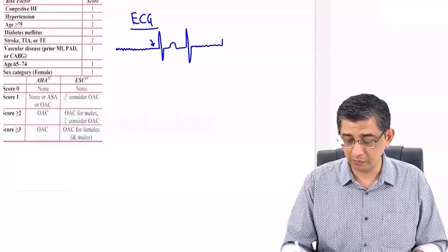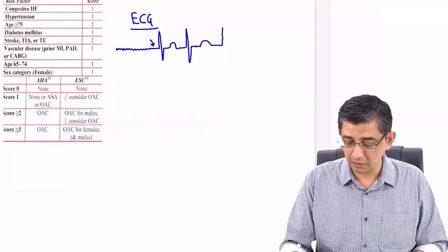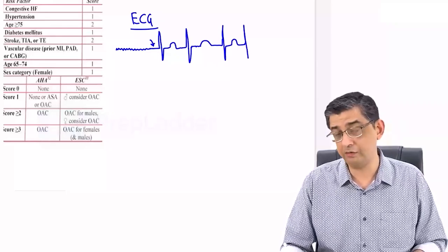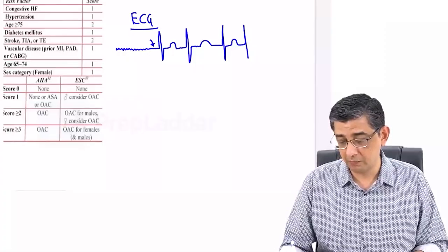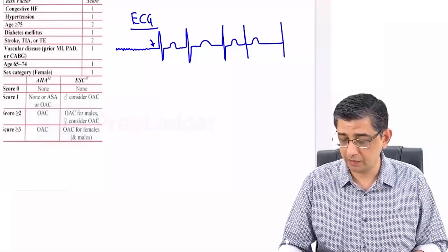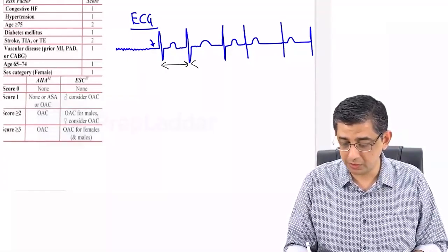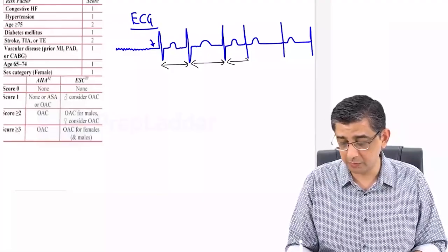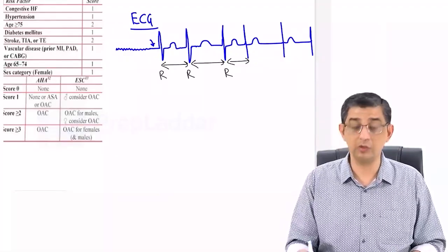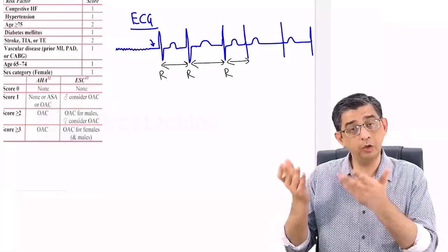And then the next problem that will come up is, again, I'll just highlight the fast beating of the heart, and a very characteristic feature that will occur in these patients in the ECG. I highlight once again, the twitching part may not be visualized, but you will still be able to pick up the ECG. That part is, guys, that in this particular chart, the RR interval will never be constant. You see, in all tachyarrhythmias, mark my words there, in all tachyarrhythmias, the distance between the R and the R wave will always be constant. But in these patients, RR interval will keep on changing, and in between, heart rate may be normal.